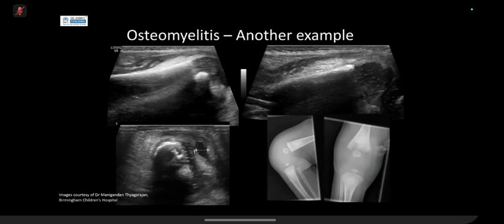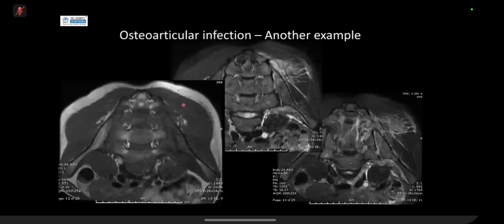Okay. We've got another one. So septic arthritis of the SI joints, very common in kids. Don't ask me why. And what you're looking for is the characteristic sign. So this is T1. You can see there's a lot of red marrow, so T1 is not really your friend in helping you tell whether there's marrow infiltration. But STIR is quite good. So that's your SI joint here.